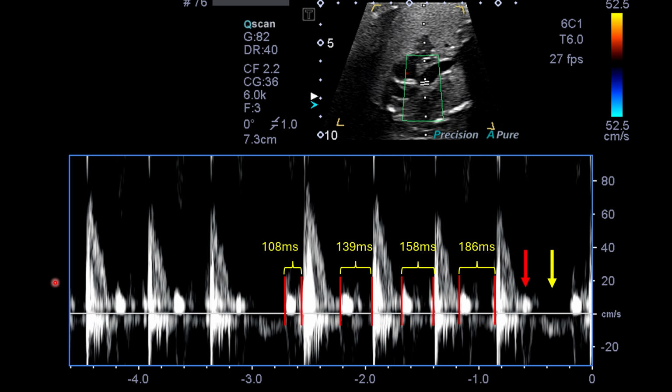And so this is the same case. This is sort of like an SVC aortic tracing, where you have this gap from the previous non-conduction, but you have a short mechanical PR interval here, and you can trace this out. Here's the A wave to the V wave. It lengthens a bit, it lengthens some more, and then non-conduction occurs here. So you have a dropped QRS or a dropped V wave with no ventricular conduction.